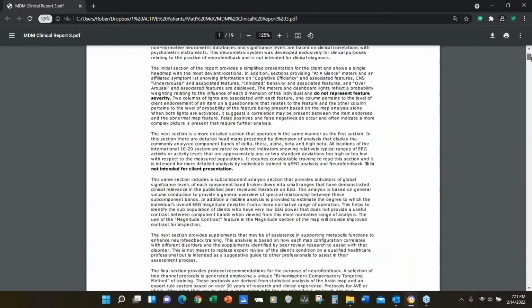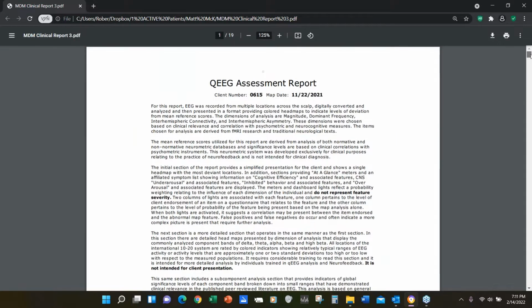I'm going to start at the top, of course. Richard, chime in, Judy, chime in. I'm just going to go over the map, each page and what it is. I'm not going to talk about interpretation. Just going to look at what a map includes.